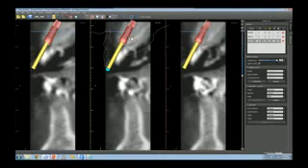So the patient had a reasonably wide ridge. So you can see the challenge on this case actually was to get the implants as buccal as possible. I'll show you that when we look at the ridge. But you can see that in a case like this, it was quite easy, without a wax-up, using the flipper as future tooth position.